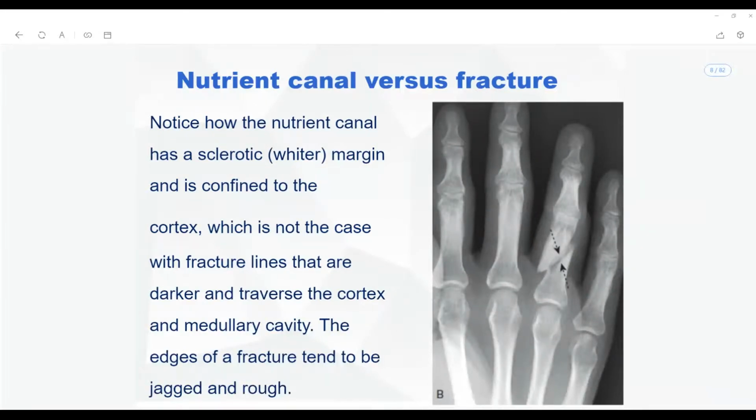Why can't you correct me? I intentionally did it. I want you to think about whether you are looking at the carpal, the metacarpal, or the phalanges. So it is the proximal phalanx which has been fractured, and that is number 4. It is not a metacarpal or a carpal. Understand? So next time you can correct it. If it is not seen in the options, it doesn't mean I'm trying to bluff you.